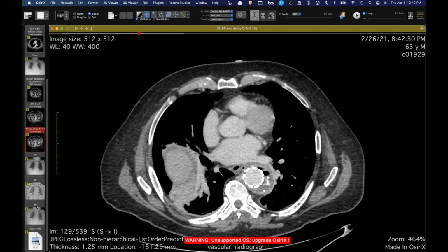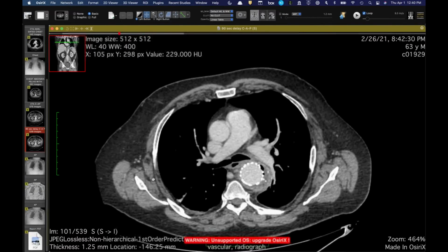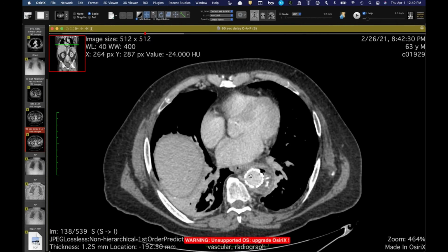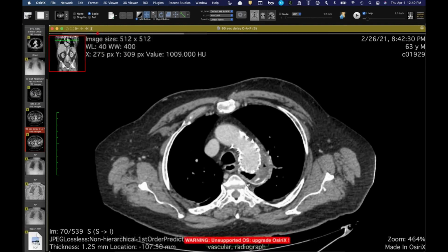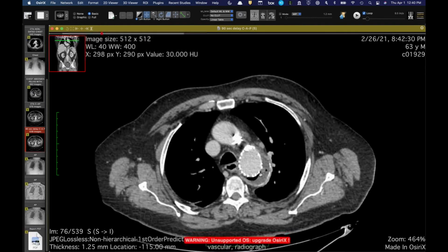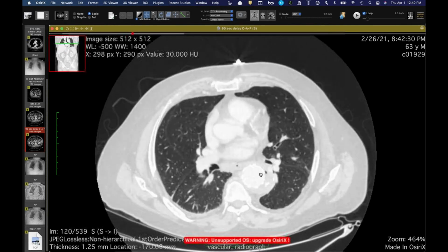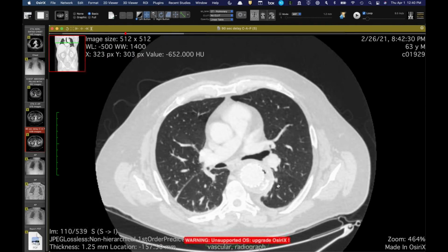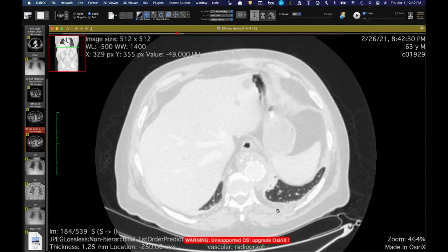So pretty dramatic appearance, but a nice pickup on the radiograph. Was there a workup of his esophagus to see if there was a fistula from his esophagus? Yeah, there was, and no esophageal symptoms, and because there's a reasonable fat plane in most areas, it doesn't look like the esophagus is tethered there, and sometimes, as we've seen with aortobronchial fistula, the lung around here looks pretty pristine too.